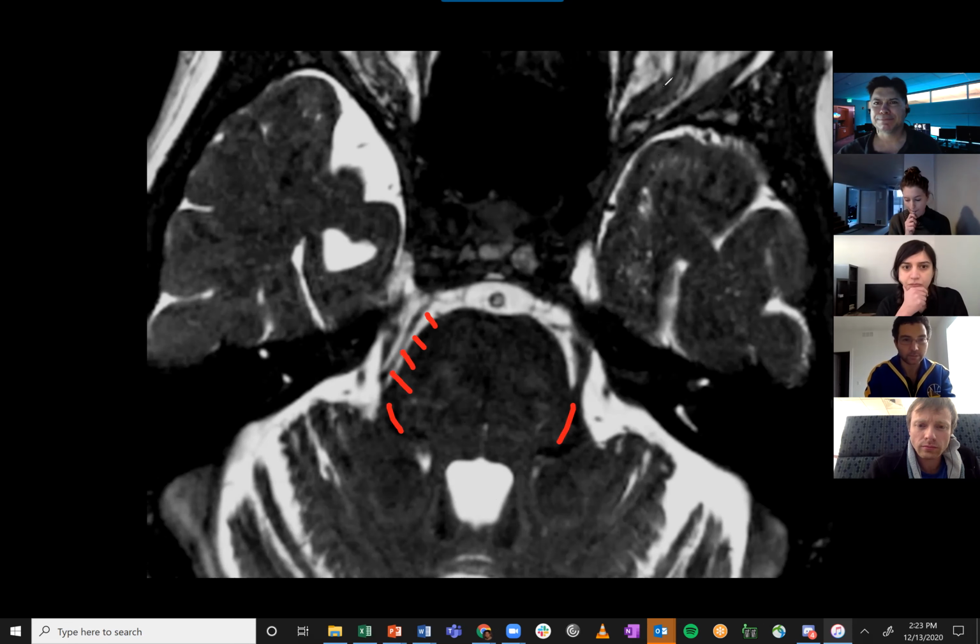It almost looks like the fibers are separated on the right, and they're smaller in caliber. I can't tell if it's a lesion that's involving the cisternal fiber. You can tell me. I'm a doctor. Yeah, so maybe.